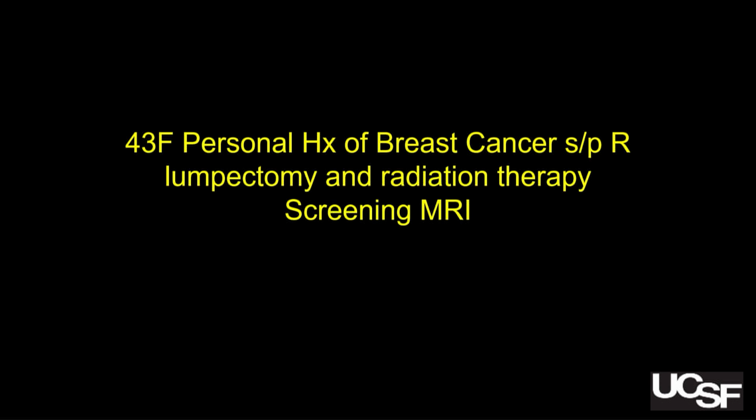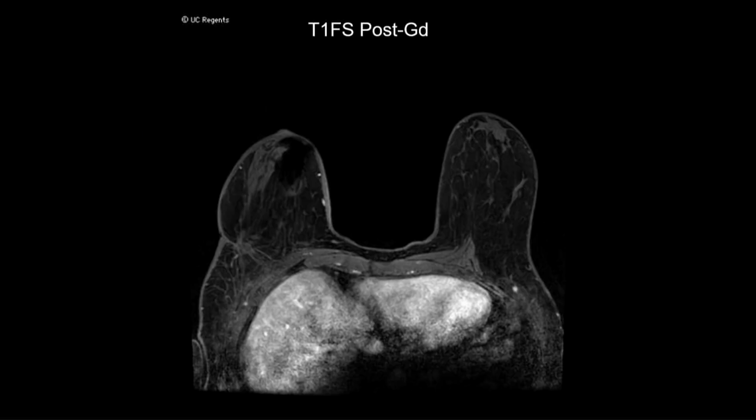All right, case 7. A 43-year-old, personal history of breast cancer, had a right lumpectomy, had whole breast radiation, and now is on surveillance. So it's a screening MR. Here's the T1 fat suppressed after contrast. We see contrast in the heart. Not a whole lot going on in the breast. That's good. You can see the scar here from the lumpectomy.